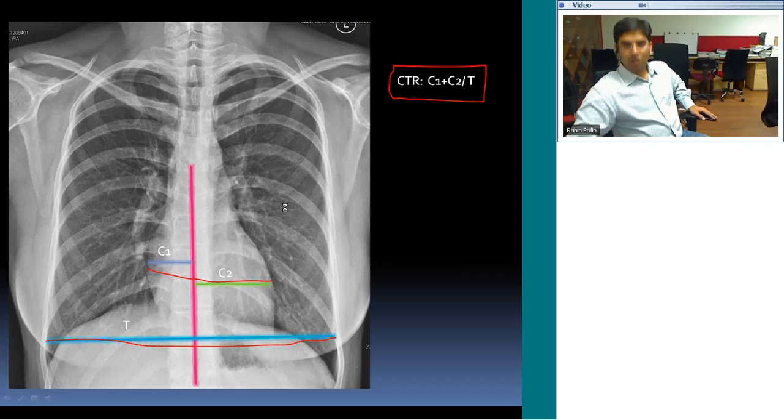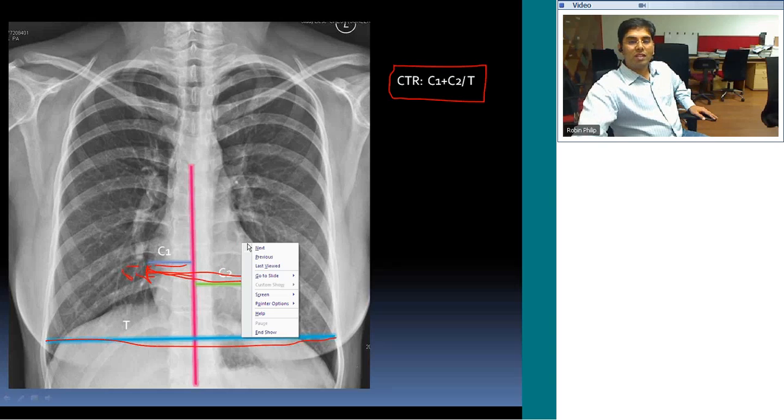I mean, say this is that maximum transverse diameter. So this will help. And one more point is from the midline, this diameter should be less than 5.5. Anything above 5.5, okay, anything above 5.5 is right atrial enlargement.